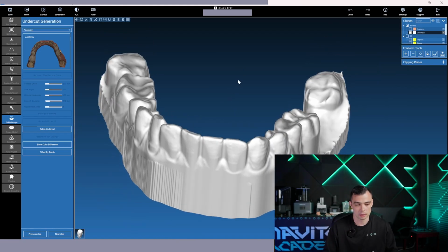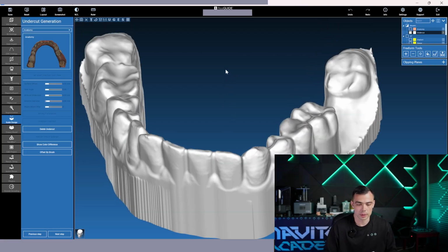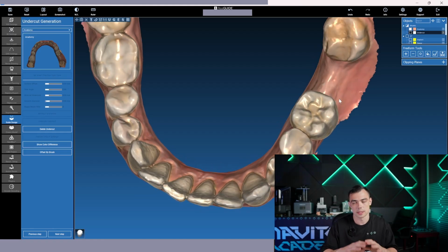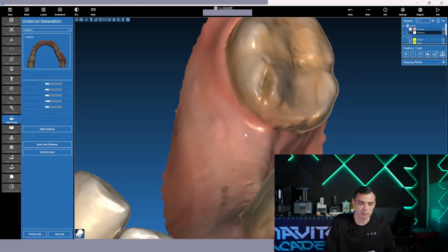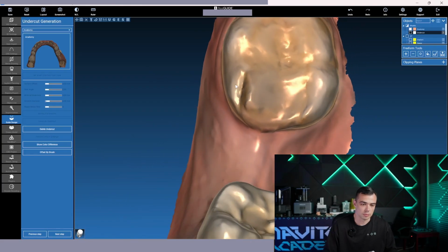Actually, when I teach my students making these guides, I also always tell them about some mistakes while scanning and while making a plaster model and the scans of it. And I also tell them about some dangerous areas which you can face. For example, these holes cannot be properly scanned. We have some strange erosions, maybe that was some kind of restoration and so on.